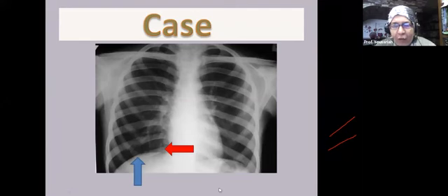We have a right cupola and a left cupola, and they are named cupola because they are semicircular in appearance with the highest point lying in the middle, okay? The right is usually a little bit higher than the left. How much higher? Less than an interspace, less than a vertebral body height.